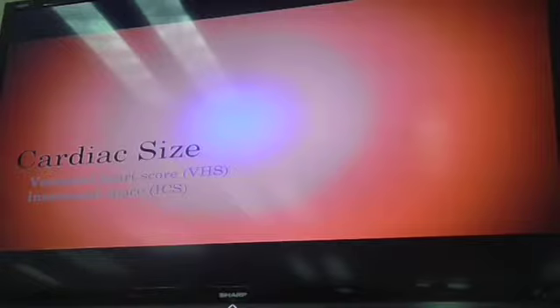Okay? So if we're taking these films because we feel there's something going on with the cardiac, or the heart size, we want to see what we're dealing with. Are we going to be the small Goldilocks or the big Goldilocks? Okay? Or are we looking at something that hasn't quite changed those sizes?